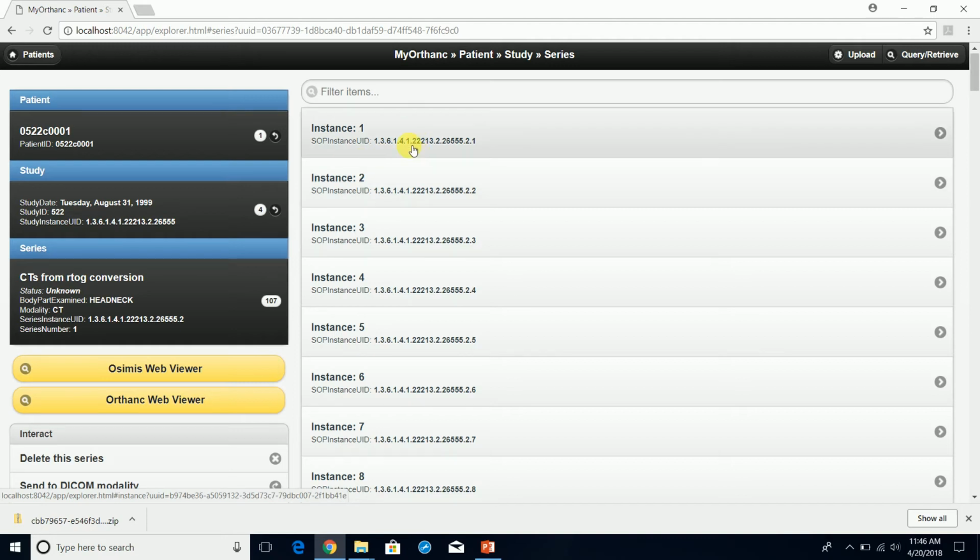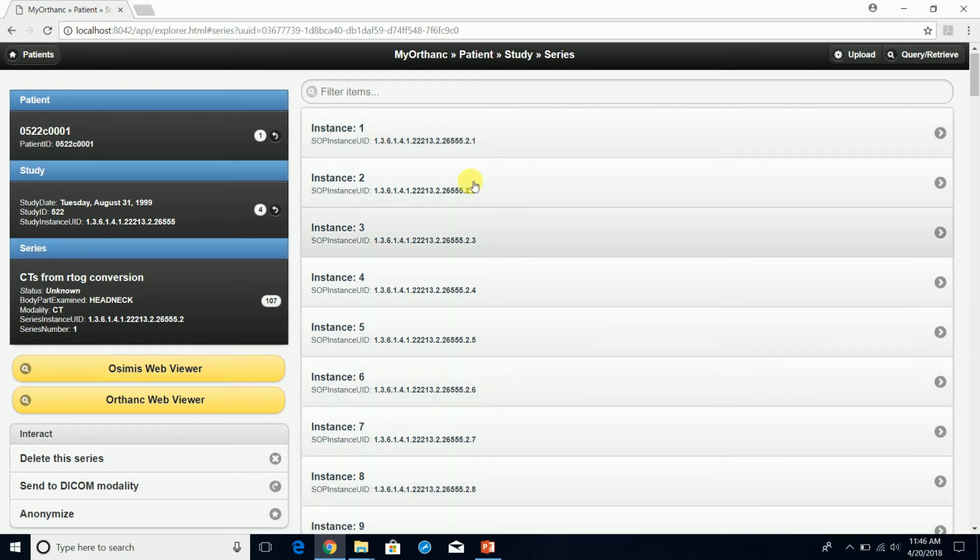We've got the image level, and the SOP instance UID. That's the unique identifier for the actual image, right? And so each SOP instance UID has to be unique. Typically, it has to be unique within the database. Some databases may not. Yeah, well, I believe that should be the DICOM standard: you have to have a unique identifier. You can't have two of the same SOP instance UIDs or series instance UIDs or study instance UIDs. But to my knowledge.